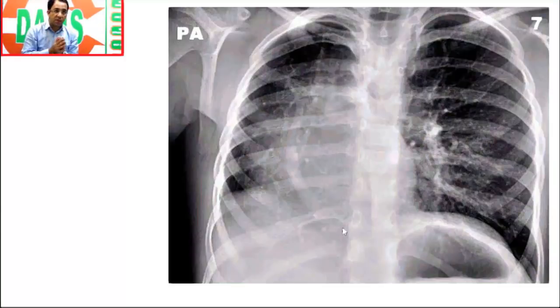That is TAPVC, and as undergraduates we have all seen the X-ray showing a figure of 8 or a snowman heart in TAPVC. This is partial anomalous pulmonary venous connection, where the right lower lobe pulmonary vein is draining subdiaphragmatically into a systemic vein, like the inferior vena cava. Probably it must be draining into the inferior vena cava.